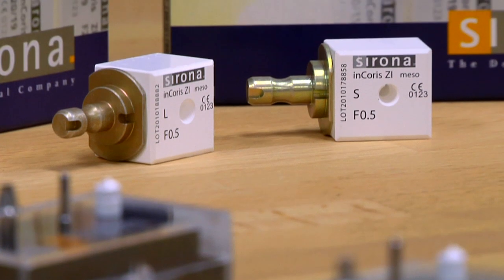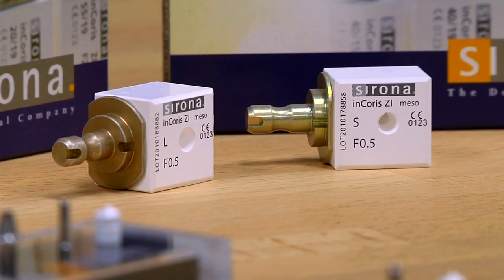Meso blocks are sold separately and specifically designed to optimize the milling and seating process of custom abutments with your InLab MCXL system. Each block ensures accuracy by providing a precise, pre-drilled hole in the center of each block that will fit securely around each of our titanium base kits. The user need only ensure the proper size block and shade for the required meso block.